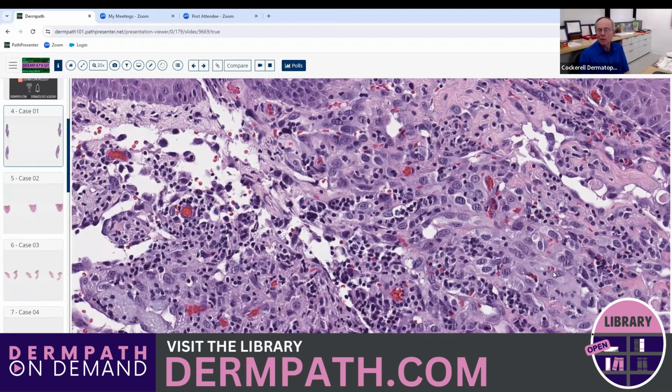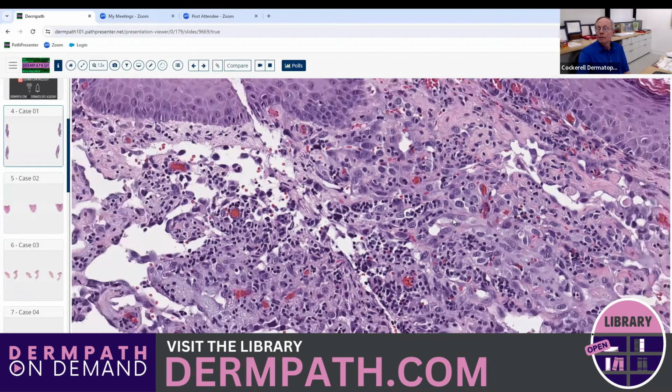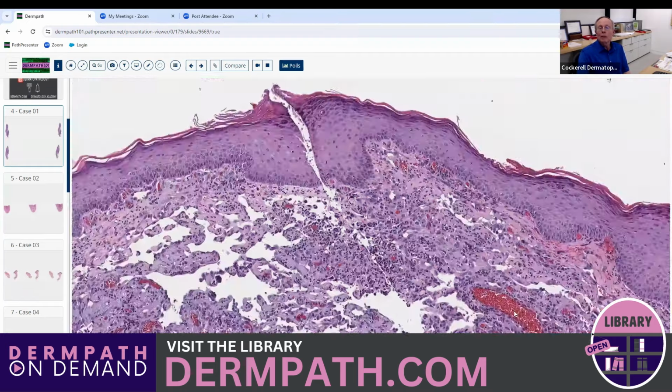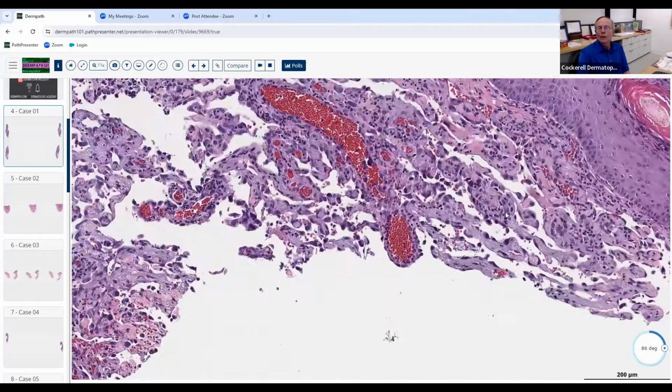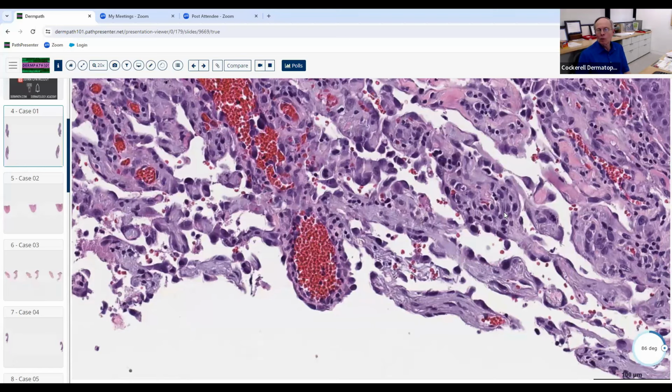It looks like squamous epithelium. And I've seen the diagnosis of angiosarcoma missed as squamous cell carcinoma before also. And then there are the very poorly differentiated angiosarcomas. They're just solid, poorly differentiated lesions.